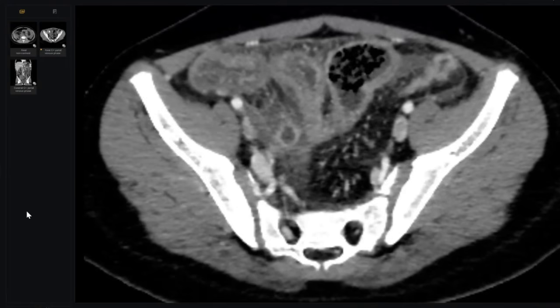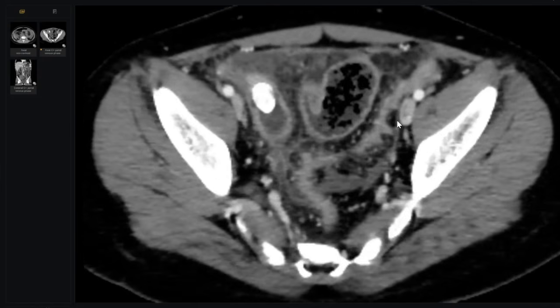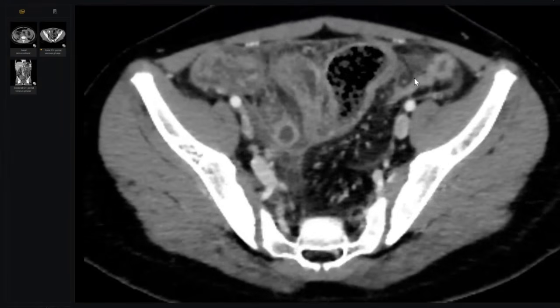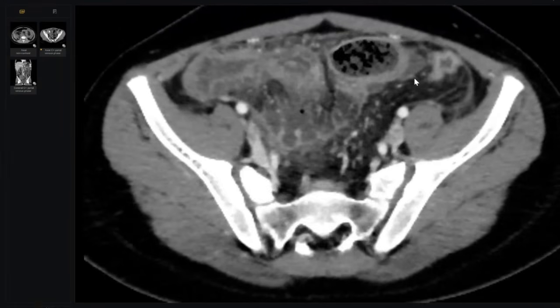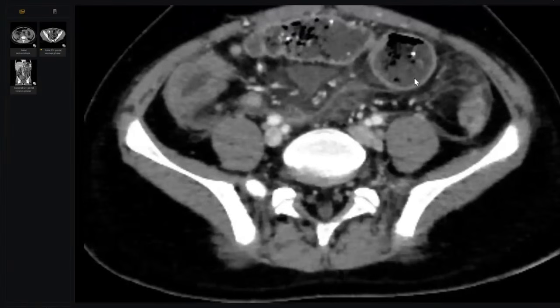Yes, sir. There is a tubular structure that has an enhancing wall and marked perilesional fat stranding and adjacent bowel loop thickening as well. Small bowel loop, marked circumferential thickening is also seen. No, sir, it is not blind-ended. It communicates with the bowel, and I can see the small bowel feces sign just proximal to this narrowing of the small bowel loop.